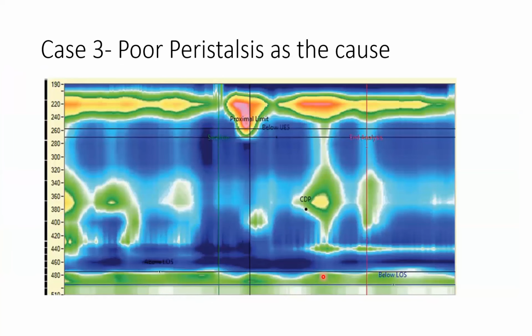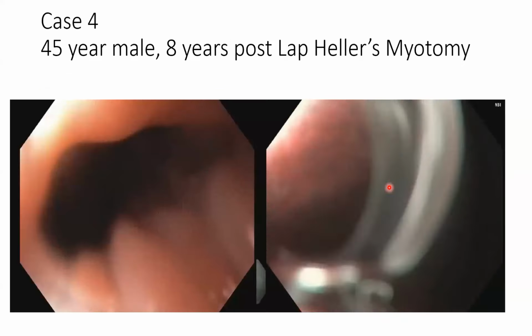Now coming to the body. You can see in this patient, again post-POEM, nothing at the LES, nothing in the body. This patient was type 1 achalasia, again had symptoms. So this patient possibly will not do well, even if you redo the POEM again. This patient will require body-directed therapy rather than LES-directed therapy.